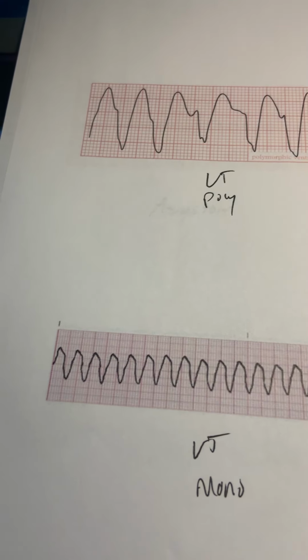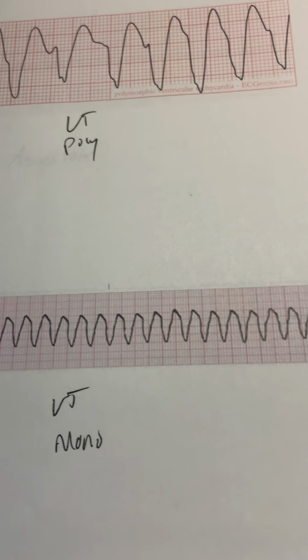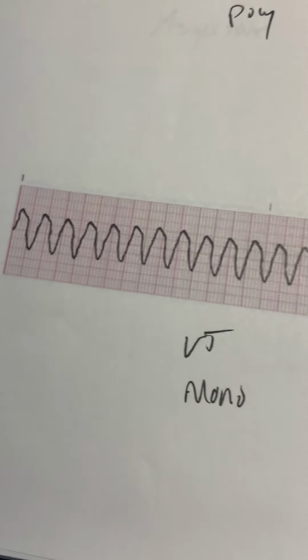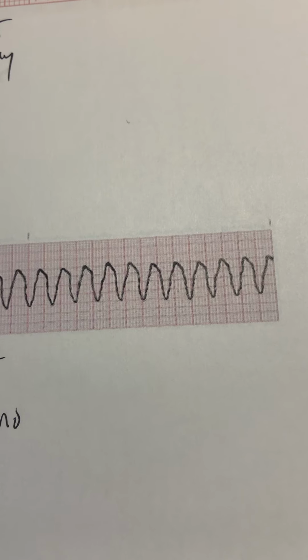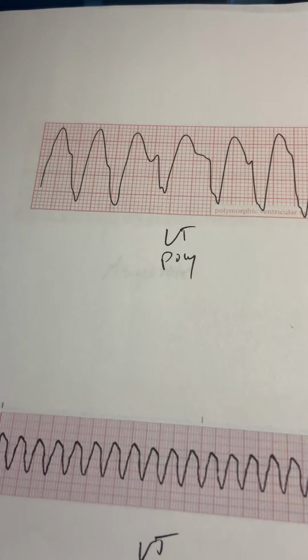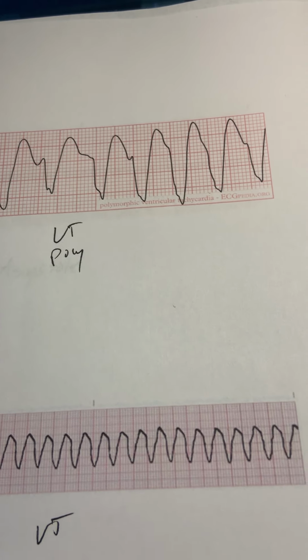And then that is another strip of VTAC that you will see, and this is usually what the rhythm generators look like, to be honest with you. That's 9 times out of 10 that's what the rhythm generators look like. But just like everything else, it is different when you're looking at it when a patient's connected to the monitor, because every patient is different.